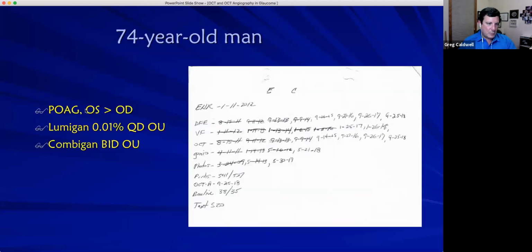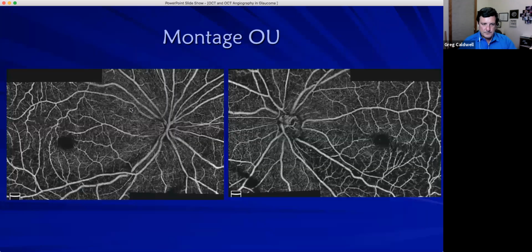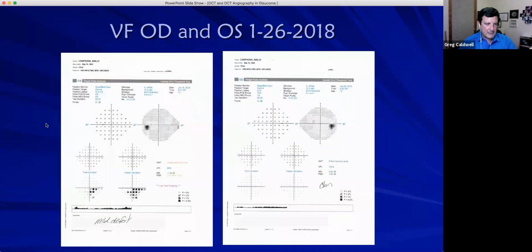So we're saying that it's worse in the left eye than the right. So let's take a look here, worse in the left eye. You can see here we have an inferior defect. It's a mild defect. It's so mild, it's only 1.30. It's very localized. And we can come over here and it hardly has any defect, right? Or it's a plus. It's not even a minus. It's 0.53. So clean visual field in this right eye, a little mild defect inferior of the left eye here.